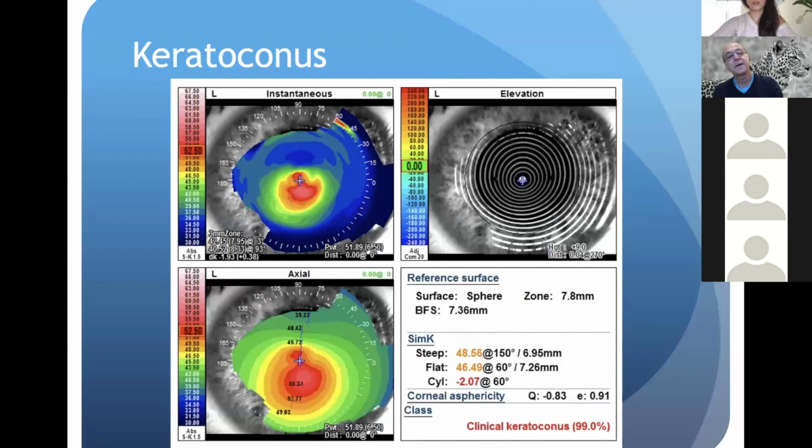In the upper one, what we're seeing is that's a little harder to interpret. You're quite correct, I think it's showing us a negative change in curvature. It's not really that the cornea is 31 diopters or 30 diopters superiorly. Look at the axial or the actual curvature map for those numbers, and you'll see that the superior cornea is actually about 40 or 42, something in that range.